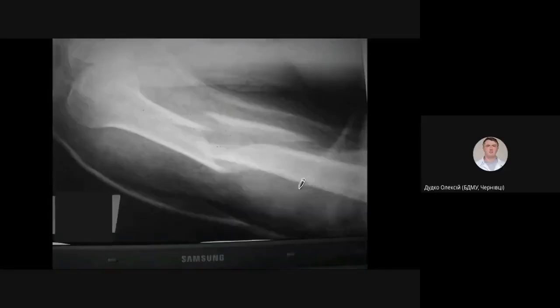That is another X-ray. So we can see an AP view here. We see that there is the head of the humerus, that is the glenoid cavity, and this is a shaft fracture. If we are classifying shaft fractures, remember we should divide our shaft into 3 equal thirds. So that would be a fracture of the upper third.